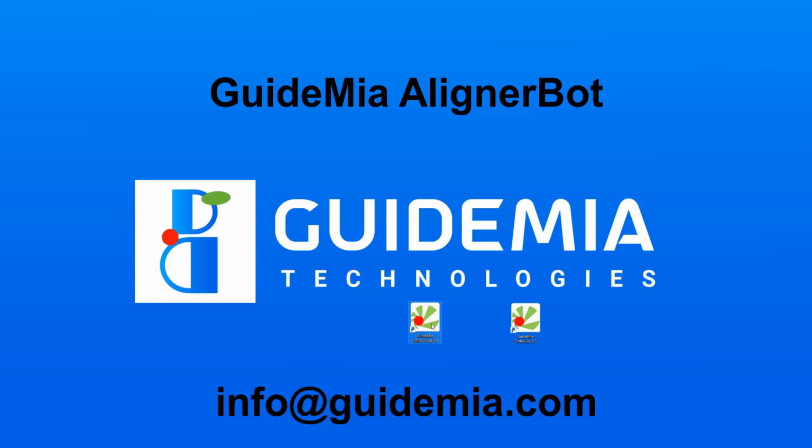I am thrilled to introduce you to GuideMia AlignerBot, the world's first SaaS system for orthodontic treatment planning and aligner design. In this Get Started guide, you will learn how to prepare a case, submit for automatic design, review the design and then download the results.